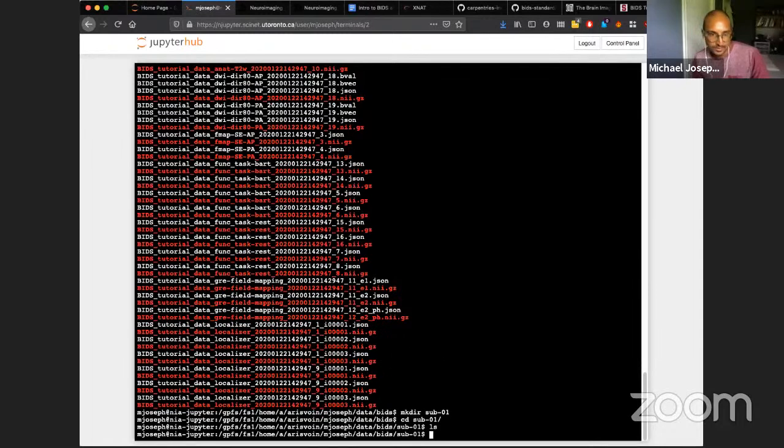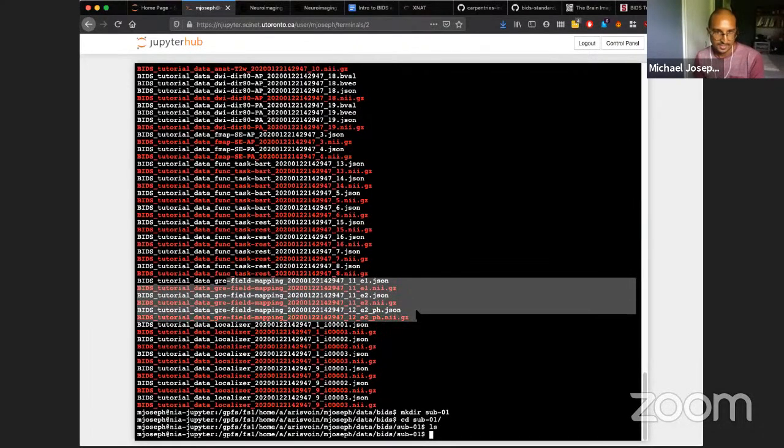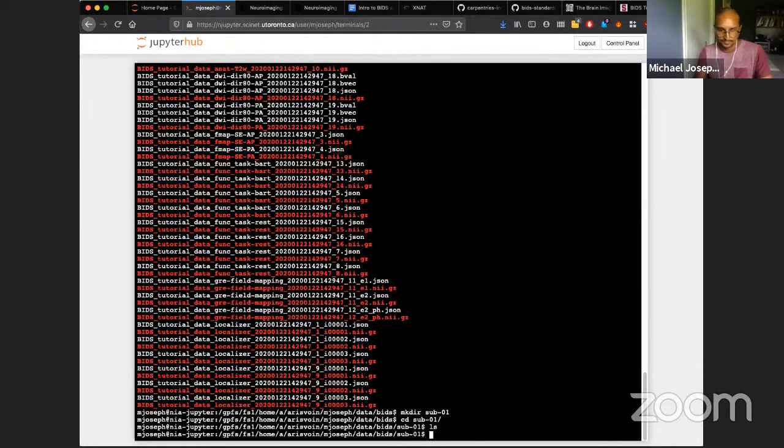Yep, it creates individual NIfTIs for every single scan. And I think dcm2niix is pretty intelligent in the way that it creates these NIfTIs. Sometimes you might have 1 series number, but 2 different kinds of scan parameters within it, and it'll be able to tease it apart like it's doing with this field map. So like here, you'll see that it's grabbing the different magnitude files and the phase difference files all in one.